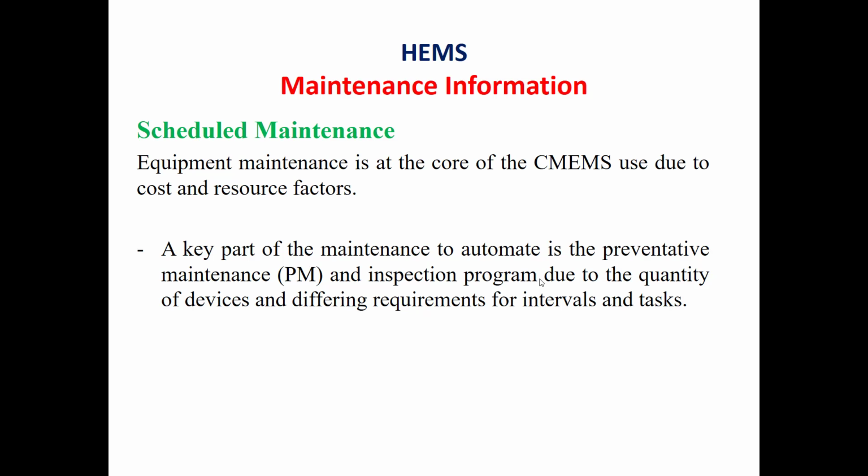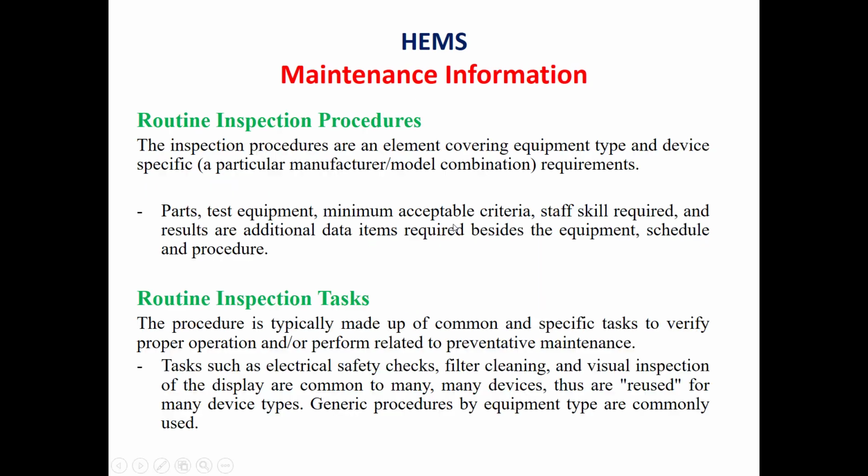For example, in the case of a hospital or even a medical center with a large number of medical devices in its medical inventory, this task will be very difficult: to make a preventive maintenance schedule and to assign this task to staff in the clinical engineering department. So having a computerized medical equipment management system will automate this process and will make it easier for the staff and will save a lot of time and cost.